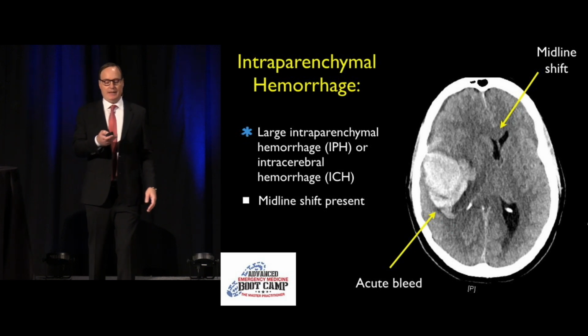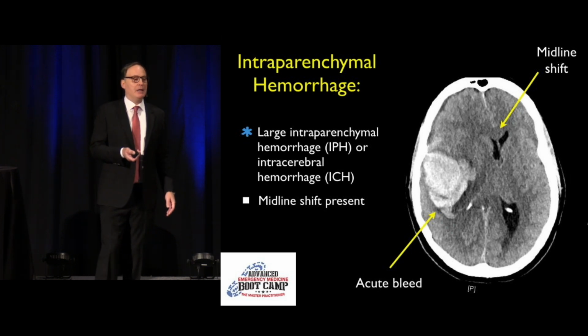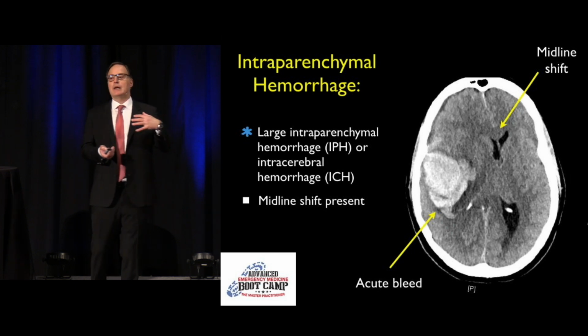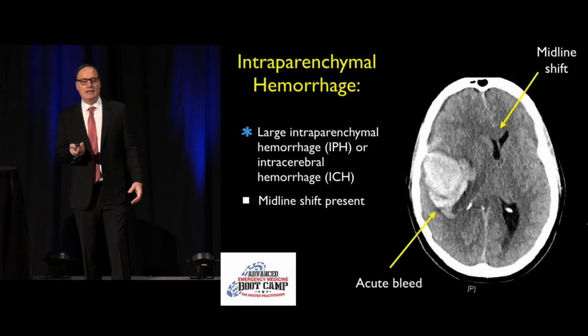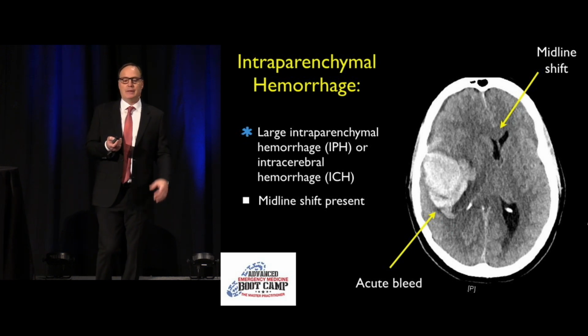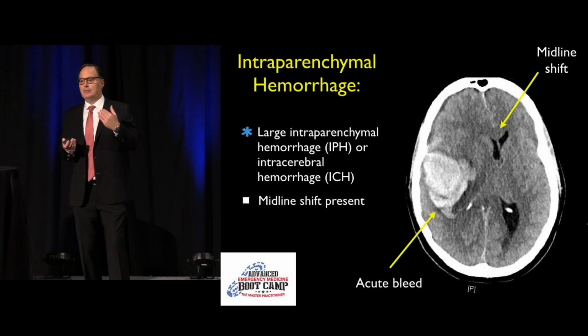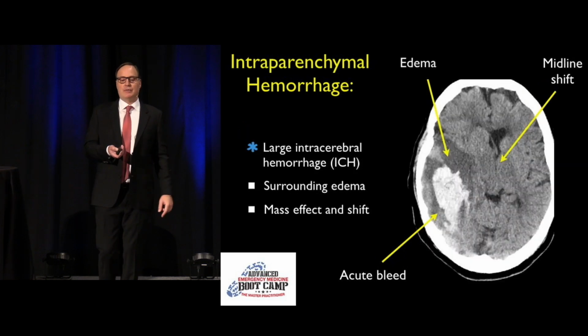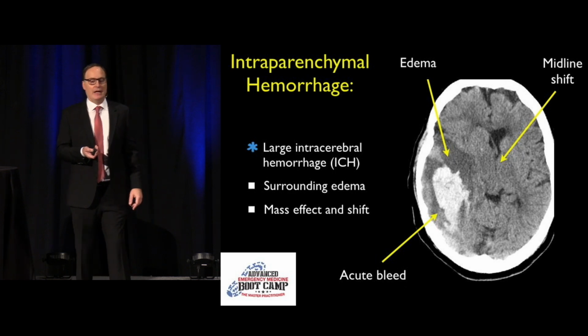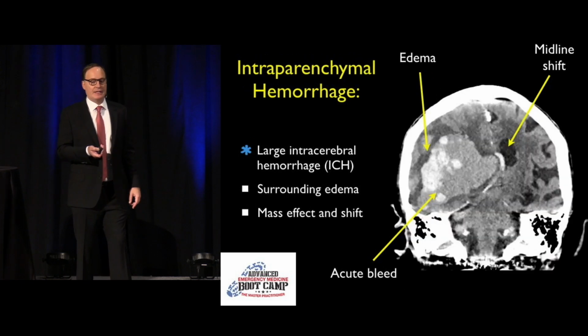And we can also see the development of some edema around the bright, or hyperattenuated, area. We talk about attenuation in terms of CAT scan. It's all about the Hounsfield units, but bright is what you will see with acute blood. And we start to see some darkening around there, and that's actually cerebral edema that's building up. Here's another one where you have some more edema, again, subfalcine herniation.